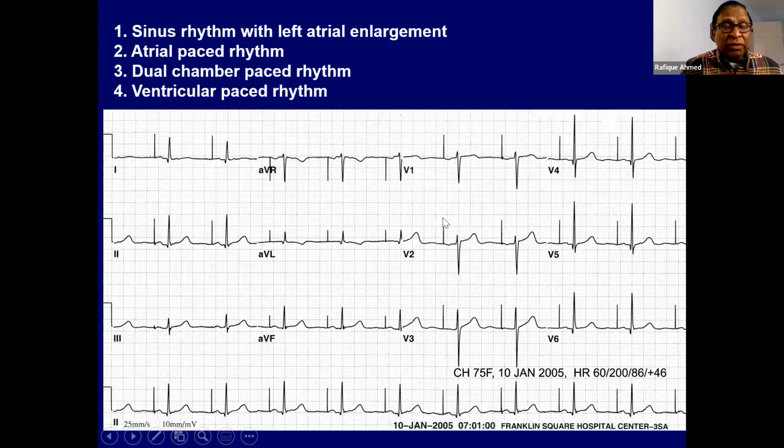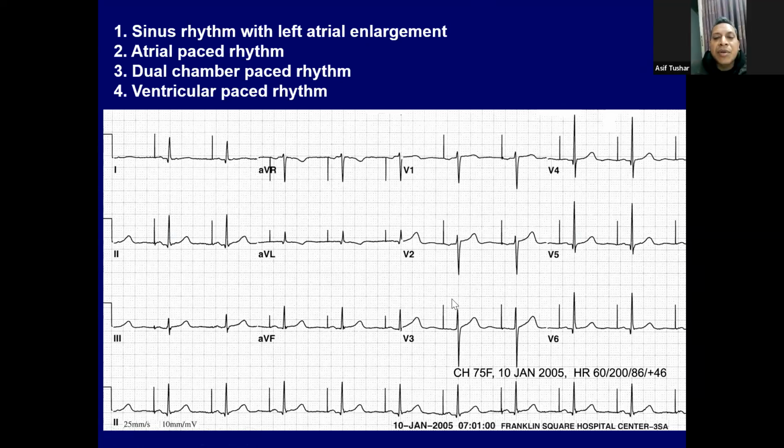So I'll show some ECGs and we'll have a question. Do we have the poll? I request all 62 participants, except for the faculty, to answer. Mr. Kamrul, please arrange the poll. Yes. Keep the ECG up for 20 seconds, sir.